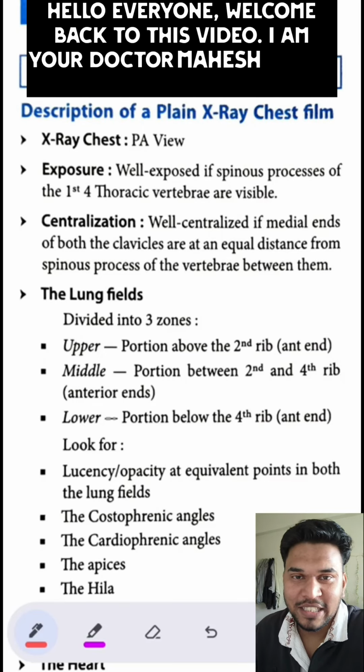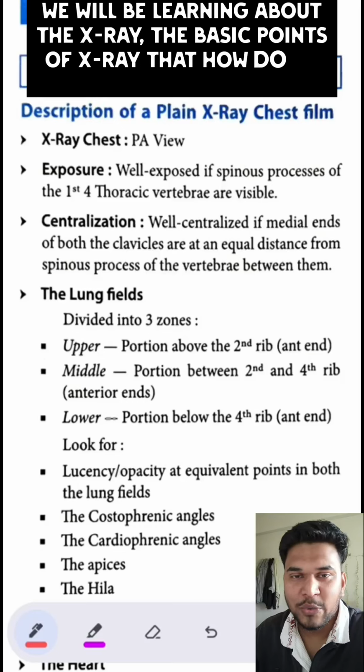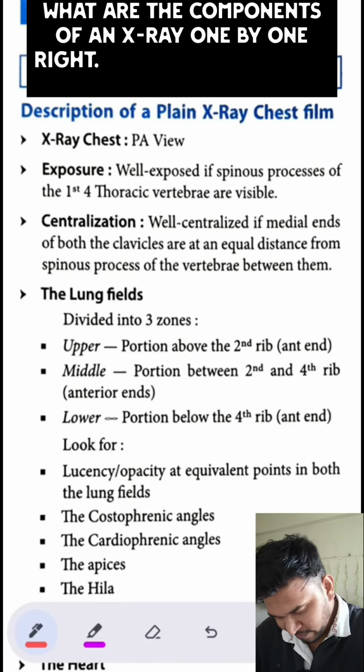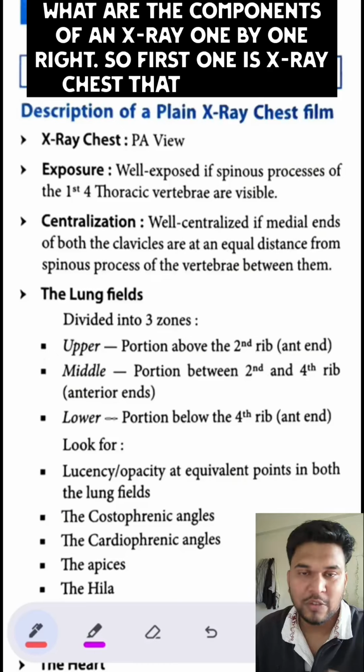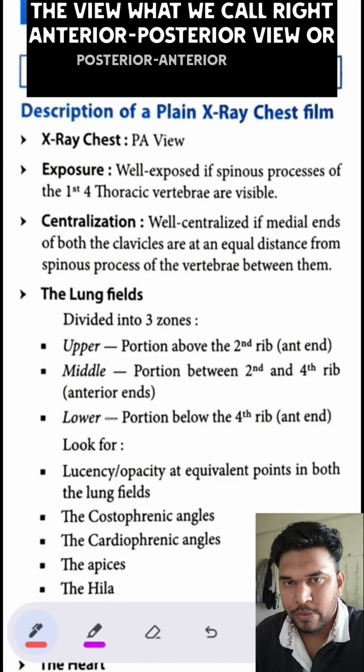I'm your Dr. Tinyhuman. In this video, we'll be learning about the basic points of the X-ray, how we need to identify it and what the components of an X-ray are, one by one, right? So first is the X-ray chest, that is the position, the view, what we call, right? Anterior-posterior view or posterior-anterior view.